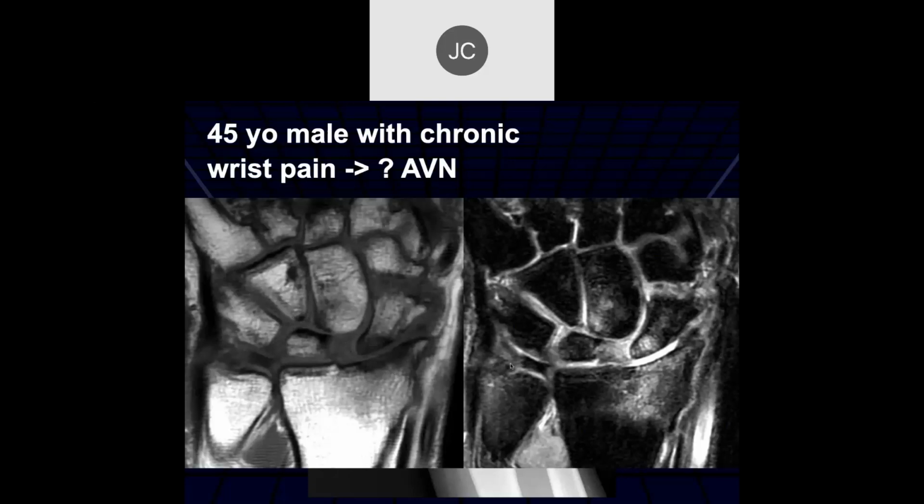So what do you think is going on here? I don't necessarily think it's AVN. There's edema there, so I think it's at least perfusing. I want to say there's probably a chronic tear of that scapholunate ligament, and then this would be early degenerative disease over here.